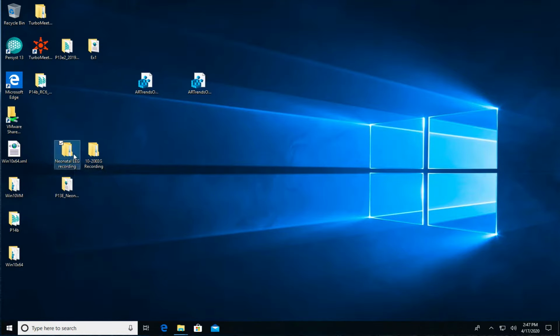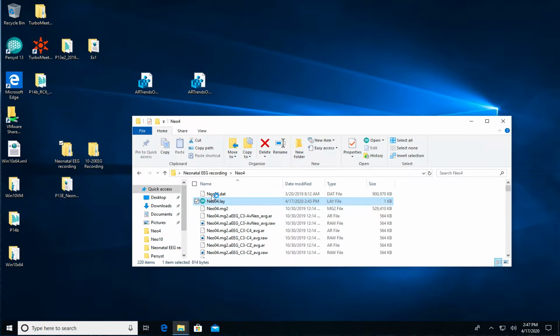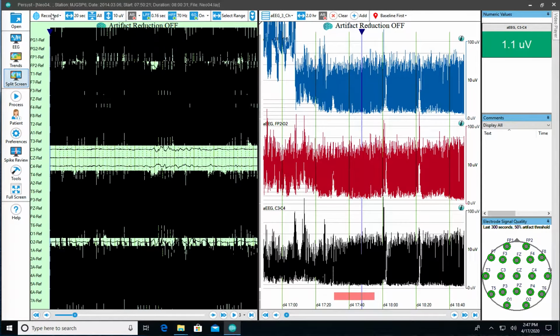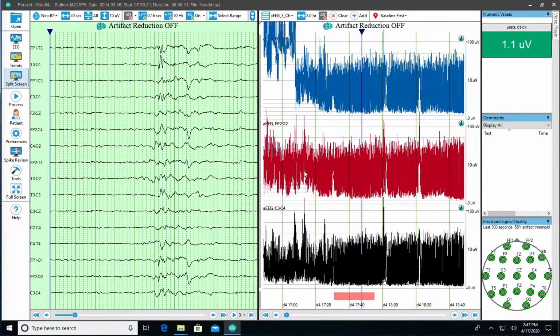So I'm going to open up a neonatal EEG, and we're going to start just looking at what the default trends are in this for our trend panel, and then we're going to make modifications from there. So let's jump ahead into the recording. Let's go ahead and go to a neonatal bipolar montage.